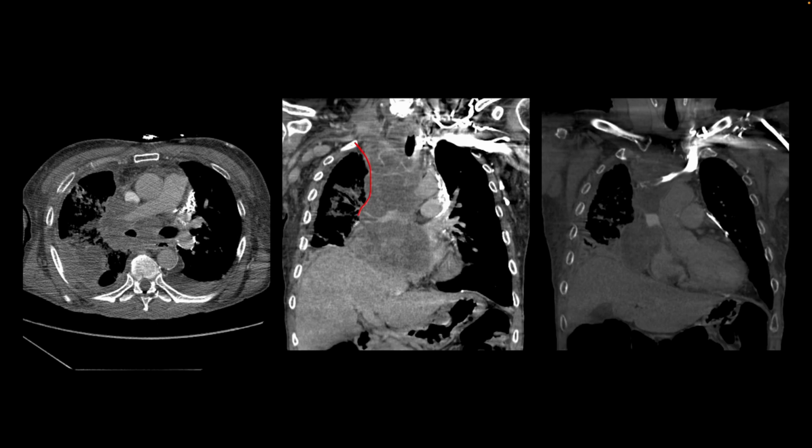This patient has extensive cancer, seen best on this coronal image. There is lymphadenopathy, pleural effusion, and encasement of the brachiocephalic vein. SVC is seen right here, and so the branches of the pulmonary artery are encased and narrowed. And so those are the things we pay attention to when there is a cancer and it surrounds the vascular structures. We want to talk about encasement, abutment, narrowing, occlusion, those kinds of things.